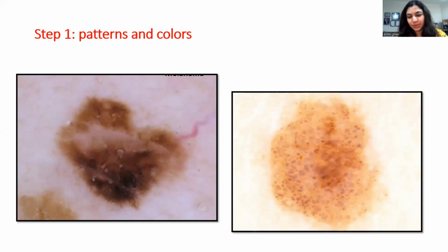Okay, I think it's pretty much obvious. I don't have to really enlarge it. Okay, so if you look at this image, is there one pattern or two patterns? I think the pattern more or less is only one. The pattern is of clods.